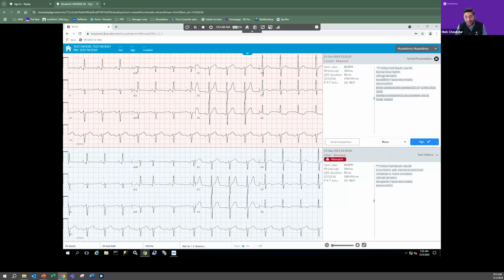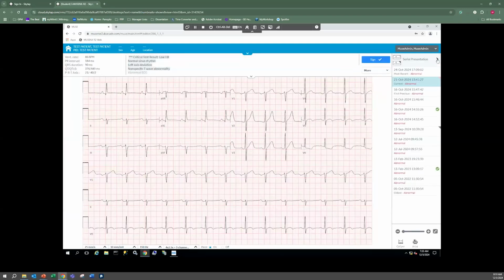I love the questions. I wish we had a few more. So please, if you have a few more, we have a few more minutes we can actually spend on this topic. So maybe Mo, meanwhile, if you want to quickly show the different tools we have to do some measurements and what kind of measurement values we see in the web client. And then let's see if there come any more questions before we move on to the next topic. Perfect, thanks, we can do that.